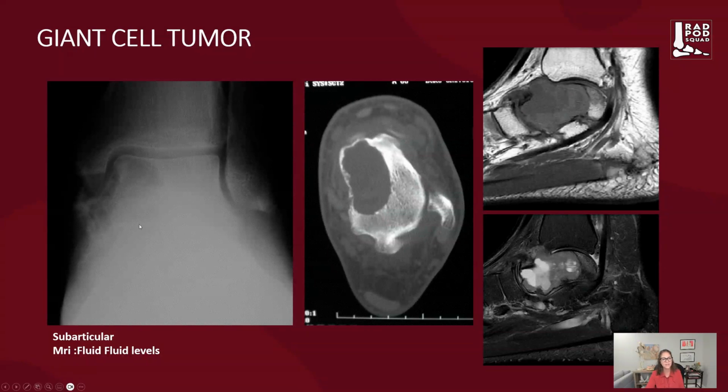Here in the talar dome, we can see replacement of this talar dome at the subchondral plate. We did a CAT scan. We can see that it nearly replaces, and there's some cortical irregularity along the medial border. Here we can see the MRI replacing the cortical bone in this subchondral, very large lesion that's at risk to fracture in this patient who has a biopsy-proven giant cell tumor.